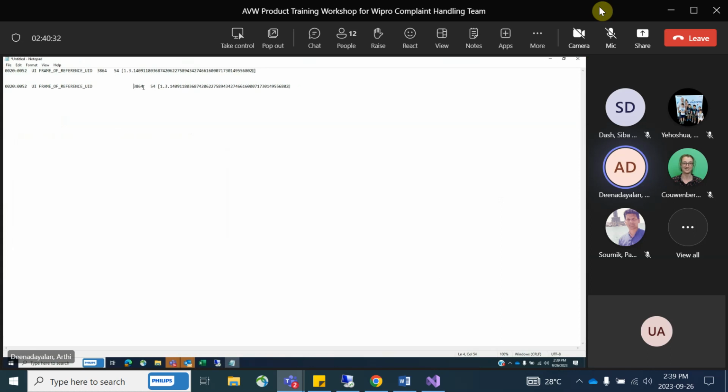Now if you see the frame of reference UID for both the series, the number is the same. Since this is the same, the linking automatically happens in the MMV. This is how you actually check it, Usman. Got it, right? Yes.